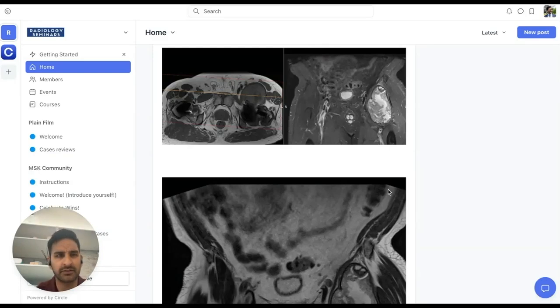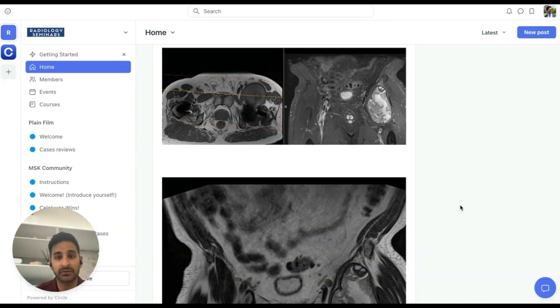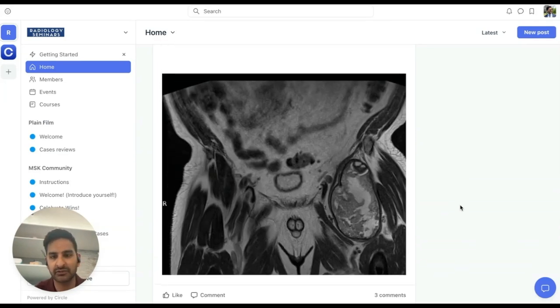I'm a consultant radiologist and one of the people that run the radiology seminars and this MSK community. We're going to do a roundup of cases every once in a while so that people, if they don't want to scroll through, can just watch the video and hopefully learn a few things. Let's have a look at this particular case that was brought up.